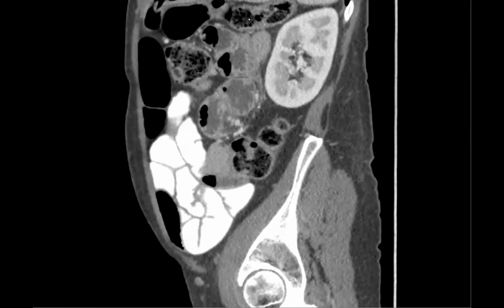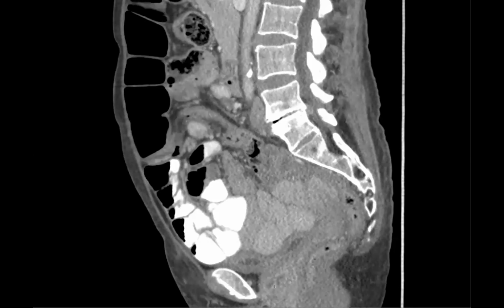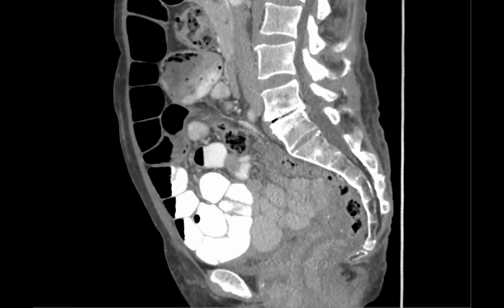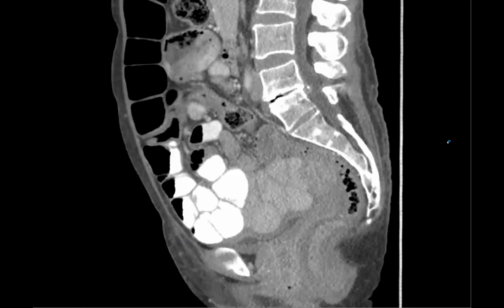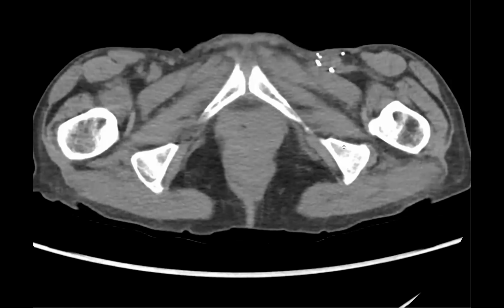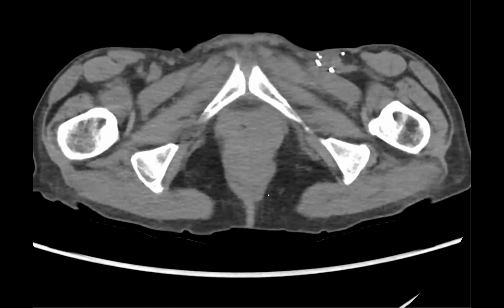I do think that helps localize it to the urethra probably. For the pelvis, I mean, that's my go-to, sagittal. Yep. Yeah, so this was a urethral cancer with a lymph node, and then they did well actually. So then years later, we were seeing the Mitrofanoff, and actually, if you go back here, you can see that they have that inguinal nodal dissection, and then they're missing their urethra here.